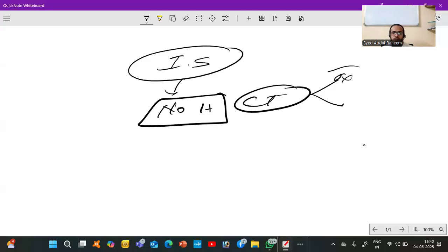First, when you are looking at the CT, you have to see to what extent the ischemic stroke is present. And second, what is the time period when the patient arrived at your clinic: is it within the window period or outside the window period?